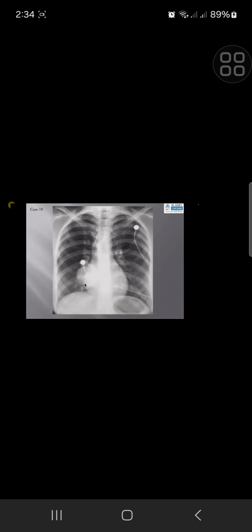Thank you. Yeah. I mean, just to bring clarity into how you describe these things. I was also in the same position as you, wondering what is that structure? Is that in the mediastinum? And then get confused. But if you think clearly, if it's in the mediastinum, you may be able to see its outer margin because that will be outlined by air.